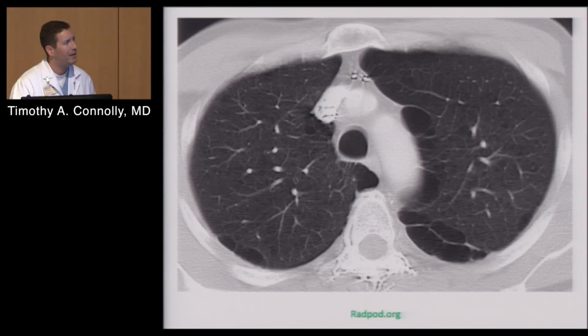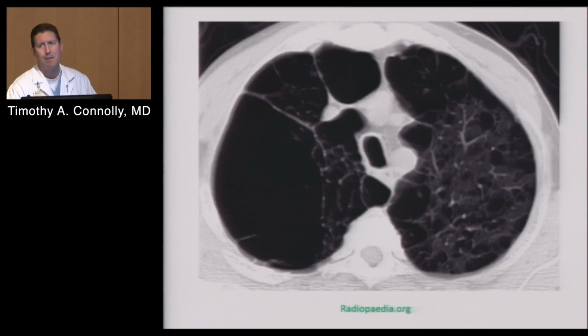For COPD, two basic patterns that we regularly see. When you see paraseptal emphysema, it's up against the pleural edges. And then bad bullous emphysema. Someone who's got this much lung destruction, I can't help with those coils. There's not enough tissue to grab onto.